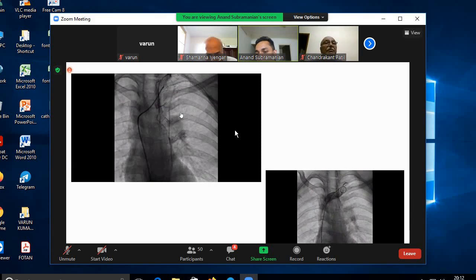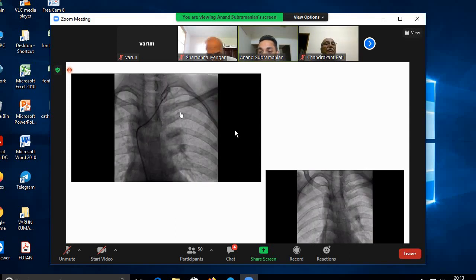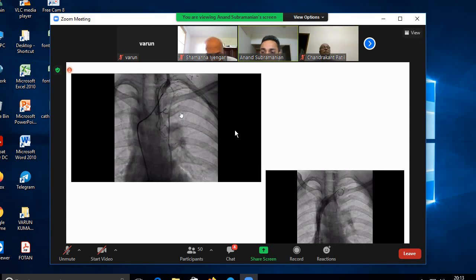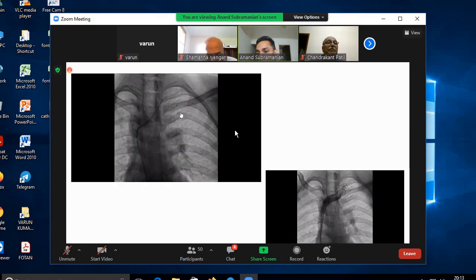So with an innominate vein injection, a good sized innominate vein and a right-sided vena cava effectively excludes a left-sided vena cava. It's important to know that certain patients can have bilateral SVCs, especially in congenital heart disease. You can't assume that everyone just has a right SVC. And it becomes important for two reasons.